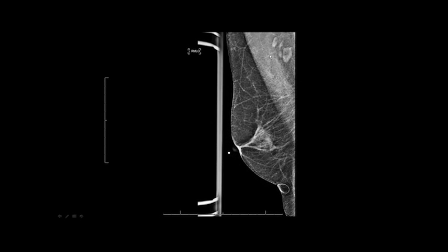I love this MLO view, wide superior to the convex border, nipple's in profile. This right here is the implant paddle. If this shows up a lot on here, I don't think they will like it. There are newer types of implant paddles that you can use for small breasted patients, but look at this beautiful IMF, nipple in profile. So I would just use a regular 18 by 24 paddle on this patient. I wouldn't have this implant paddle in there for accreditation.